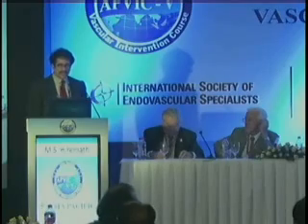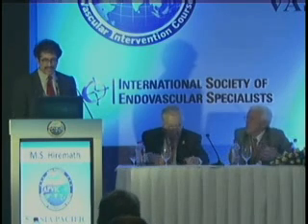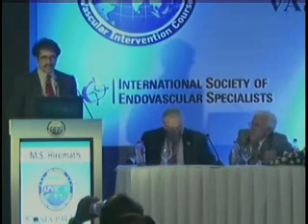So we go to the next case. Again, this is a very open forum, and we would like all your comments coming up at this stage. This is how a full atheropath would present. You can see the typical Indian coronaries, as we call it: thin vessels, diffuse disease. You would struggle, the surgeon would struggle, everything very difficult. But this gentleman also has an aortogram, which is very, very striking.